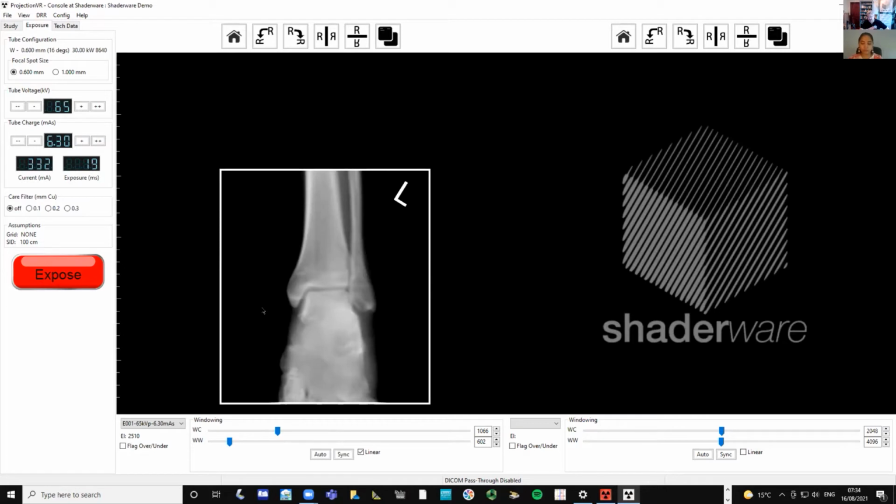If you want to just do the positioning, then obviously we've got our image here now. We can bring our DICOM header information in, so we've got our operator name and all of the settings. And we can window that so that we can see the quality of the exposure. My exposure index is showing me my radiation dose. So that's 10 times what I should have given. So these numbers are obviously very high.